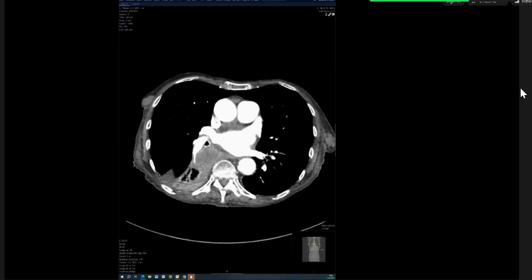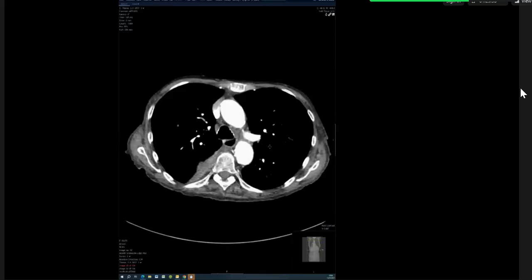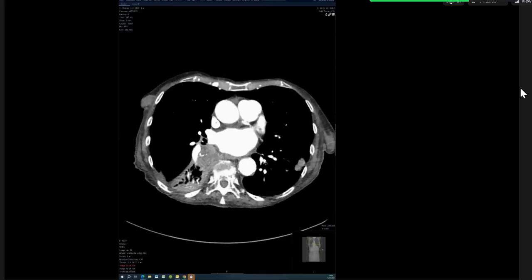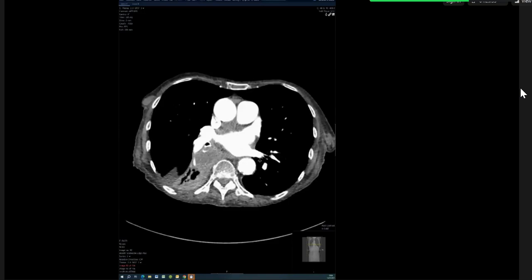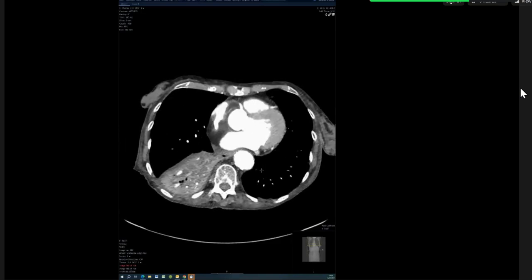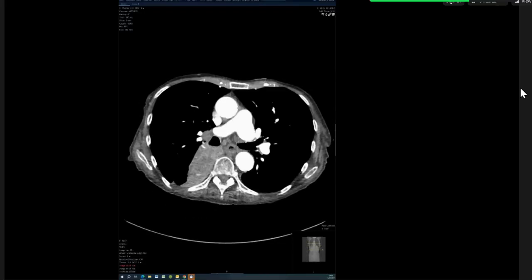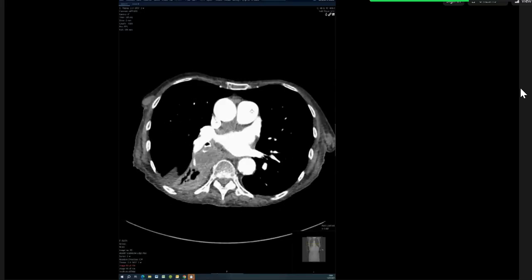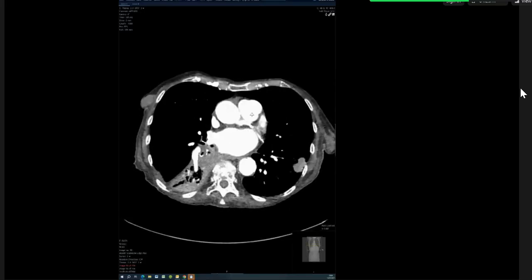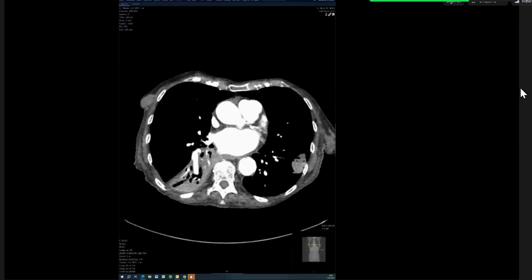Okay. Yeah. Thank you. Once you call that a primary, you then have to say nodes. For central lung masses, you have to look at the SVC because those are your urgent life-threatening findings. Lung cancer, you have to look for the Brownie points: the incidental PE, the SVC obstruction, intracardiac metastases. Those are the ones that will get you the maximum marks. Because on a CT like that, picking an abnormality isn't exceptional. It's getting all the things right, and there will always be little things on the case that will take you that extra mile to get you full marks.